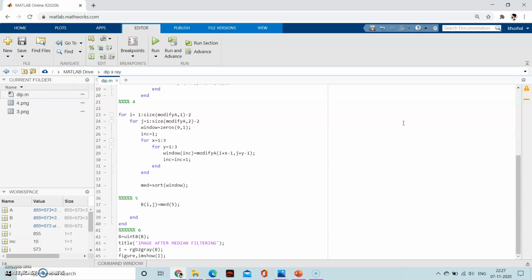My topic in medical application is that I am working on X-ray image processing. Generally, when we process an X-ray, many types of noise get introduced in it. So we are here to rectify those problems, so that the analyzer, like the doctor, can easily examine what the problem is with the patient, or the bone which he had made an X-ray of.